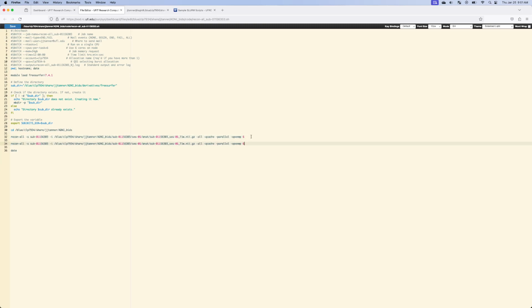I'm going to repeat it there, and I'm going to put the hashtag in front, and that would mean this is a comment, meaning it's not going to run it. So I could get rid of that. That could be what it looks like. But again, if I was going to run that and not this one, I can comment out something. So commenting out, and that would be ignored when it's being run. But I'm just going to get rid of that.